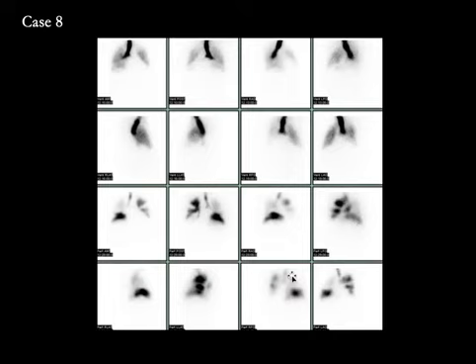So here in the right lung, apical, anterior, and posterior segments are mismatched, which are ventilated but not perfused. Posterior basal is mismatched, lateral basal and anterior basal look okay. You should be familiar with the line diagram of segmental annotation on posterior oblique views in both right lung and left lung to identify which segments are involved and to say if one or more segments are mismatched, and then based on that give it a probability. 1 moderate size to 2 large mismatched perfusion defects are classified as moderate or intermediate probability for PE, and anything less than 1 moderate is classified as low probability for PE.